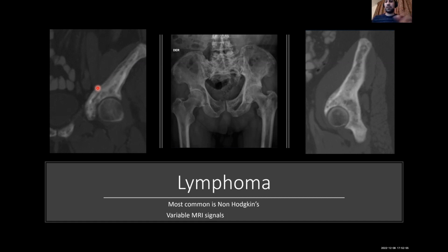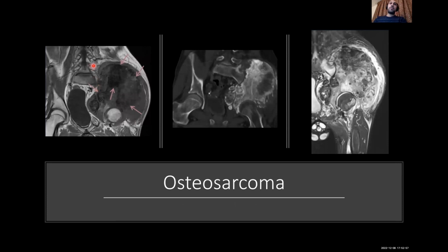Here there is sclerosis with no calcifications. Here it is mainly ossification, an expansile, destructive lesion. You cannot call it iliac bone if you don't already know that; if I hide this region and give you only that region, you cannot say it's iliac bone.